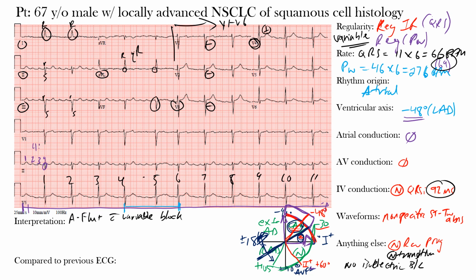So that's what we call a 4-to-1 block. And then here's another one, 1, 2, 3, 4. Okay, 4-to-1. But then you'll see here as we get a little further down where it gets variable, and that's where we have this 1, 2, 3, 4. And there's actually this initial one here. So this is actually a 5-to-1, and maybe there's 1, 2, 3 there. So notice there's that irregular response, and that's why we call this a variable block. So you don't always see this. This is quite atypical, but that's just something to be aware of.